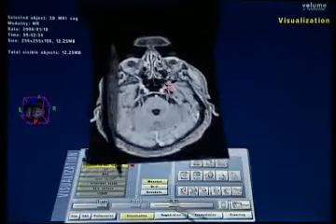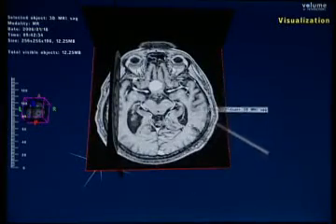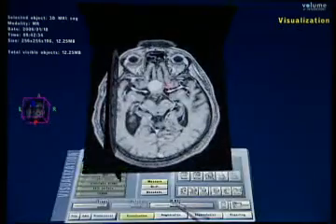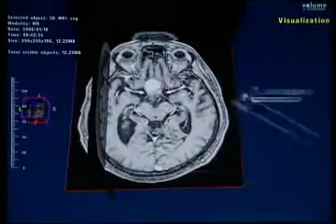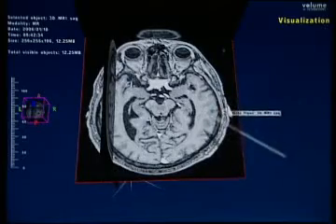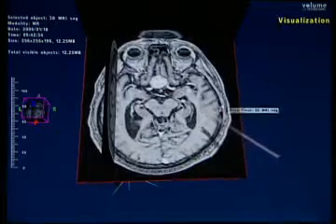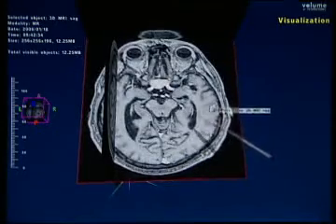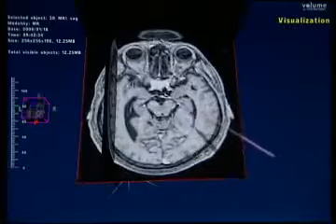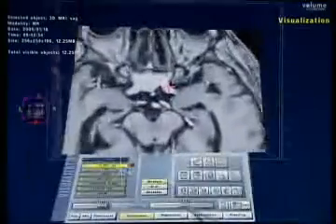So, this is the gradient echo contrast enhanced MRI. And you can see a lesion there, a meningioma. Of course, I also have to say, unfortunately, this screen is a little bit far away from all of you. There were constraints in setting up this room, so we will all try to magnify it accordingly a little bit. And you see a meningioma here. And you see the carotid arteries, obviously, in the vicinity of it.